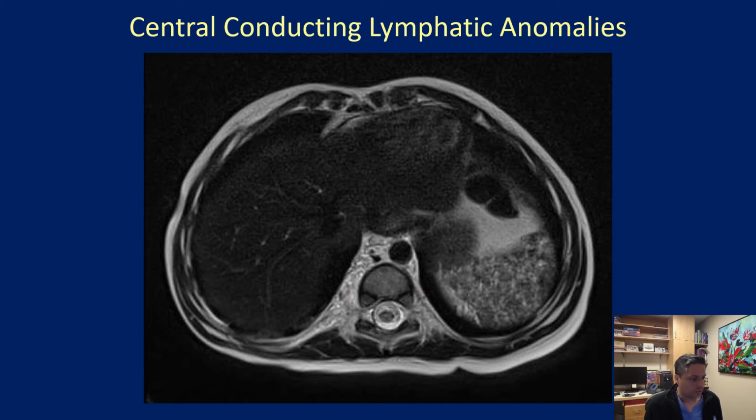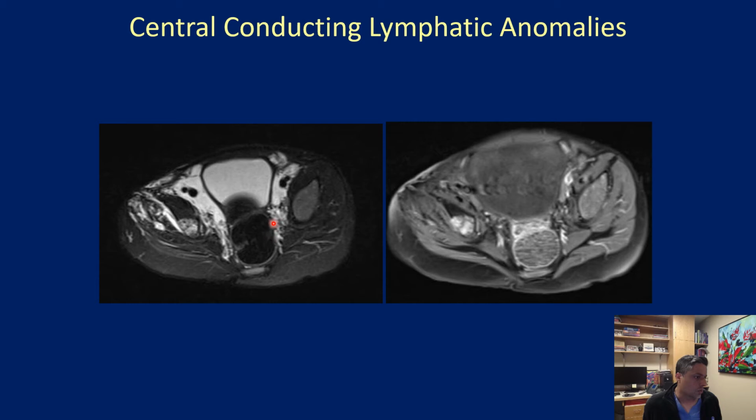in the perivascular region. Inferiorly, these continue along the perivascular spaces and can result in reflux into the bone or soft tissues, but on administration of contrast, there is no evidence of enhancement.